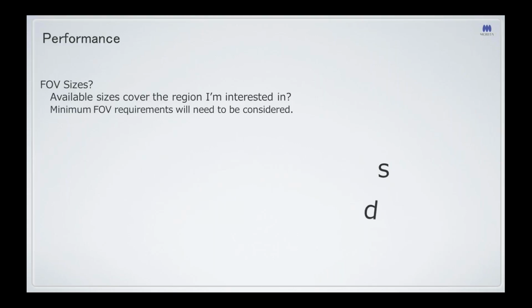Preferably small and large fields, because again, you don't always want to go large. You may want to go small to, again, focus in on the particular problem that you suspect, and also to reduce the amount of time it's going to take you to sit in front of the computer and actually diagnose images. If you're only looking at a 4x4, you can diagnose very quickly and do your treatment plan rather quickly and easily.